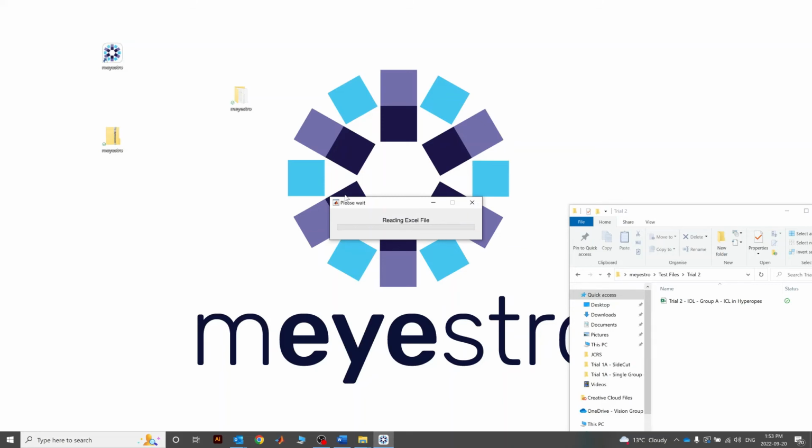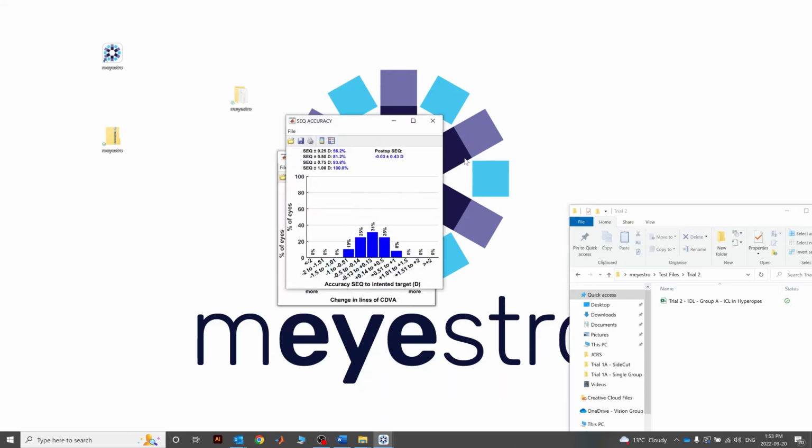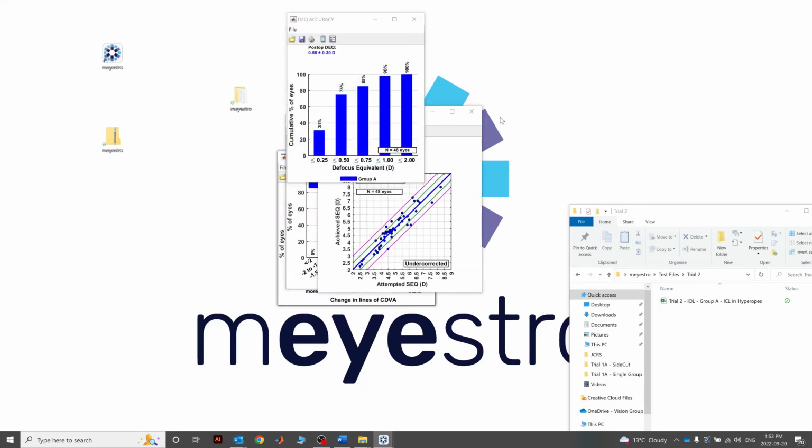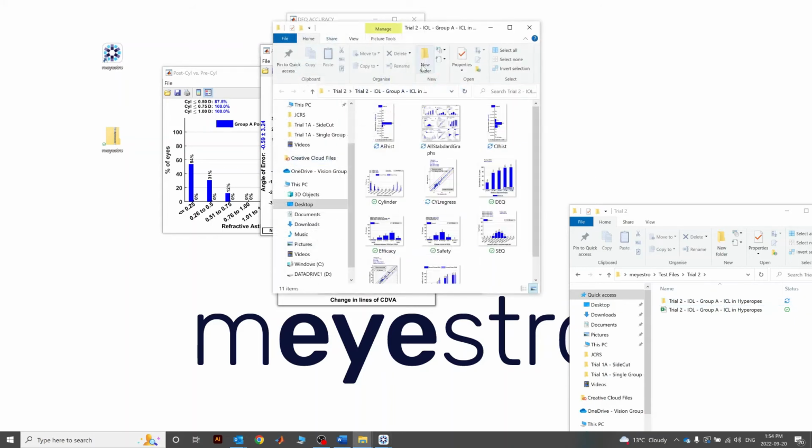And now mEYEstro is going to go ahead and do all the figures and calculation. Now the files are being saved and a folder has been automatically created, and now the folder automatically opens with all the graphs.